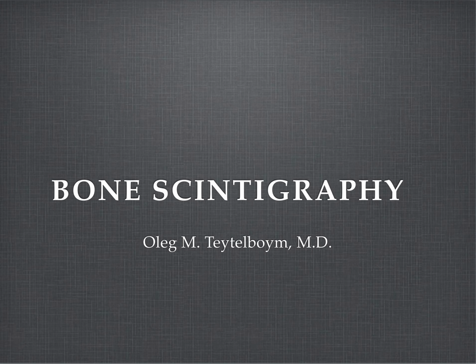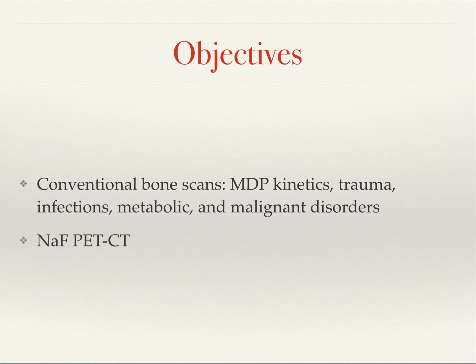Today we're going to talk about bone scintigraphy, which is everybody's favorite topic. So we will be discussing conventional bone scans, MDP kinetics, trauma, infections, metabolism, and malignant disorders, as well as briefly touch upon sodium fluoride PET-CT. Basically what we wish to have but can't have.